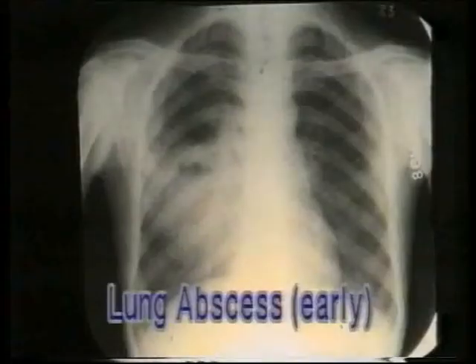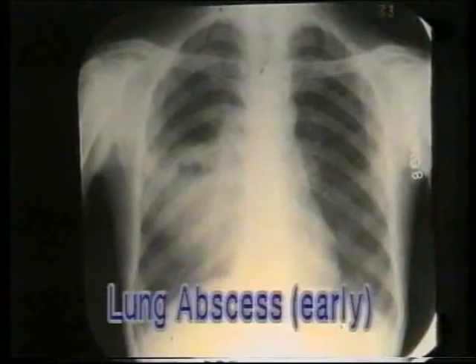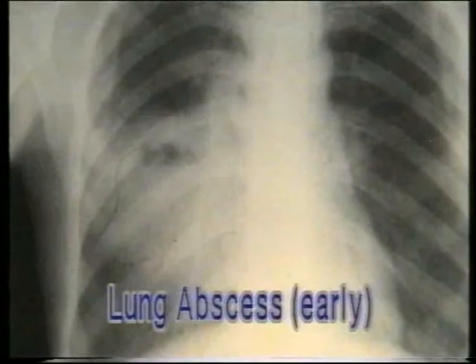A lung abscess develops in a patch of consolidation, that is pneumonia. So at the very onset, we have a patch of consolidation, or a large segmental opacity without any fluid level. Then the characteristic air fluid level appears. Note the small air fluid level at the top of this patch of consolidation in the right middle lobe. This is an early lung abscess.